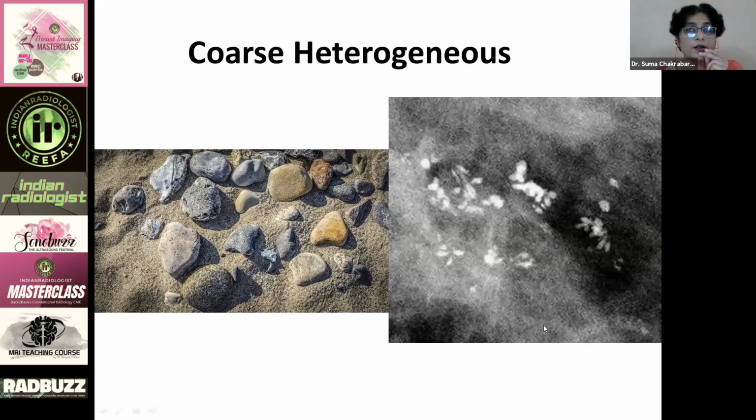These typically occur in the stroma. So they tend to have varying shapes and they tend to be quite well defined, and slightly larger than the other calcifications in size. And they don't have a ductal distribution usually, and they don't have an acinar dot-like distribution. So they are kind of free souls in the stroma. They can have different shapes and sizes, but quite well defined most of the time.